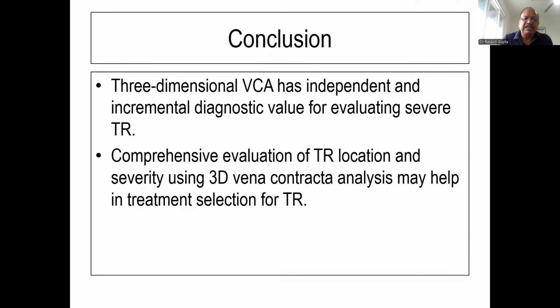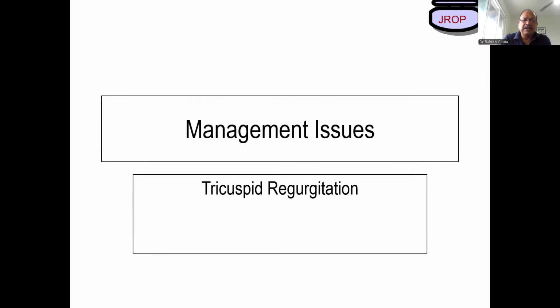And in conclusion, we can say that tricuspid regurgitation depends first on physiological TR, less than 1 centimeter square behind the tricuspid valve leaflets, velocity less than 2.75 meters. Then comes primary tricuspid regurgitation or secondary tricuspid regurgitation. We have to look at the cause of this TR jet so that we can deal with it accordingly.